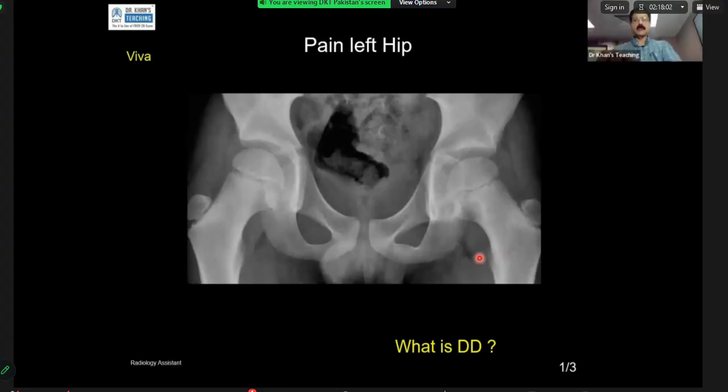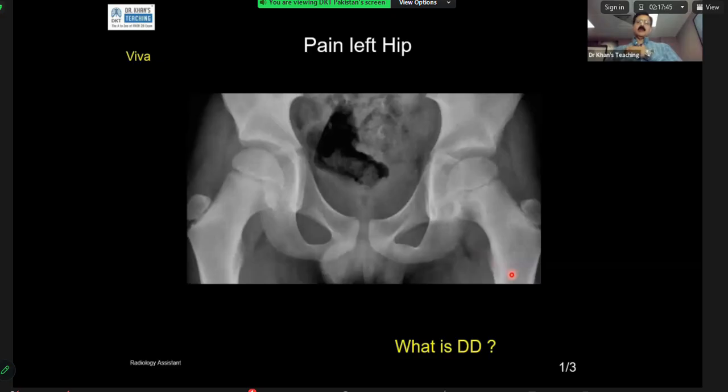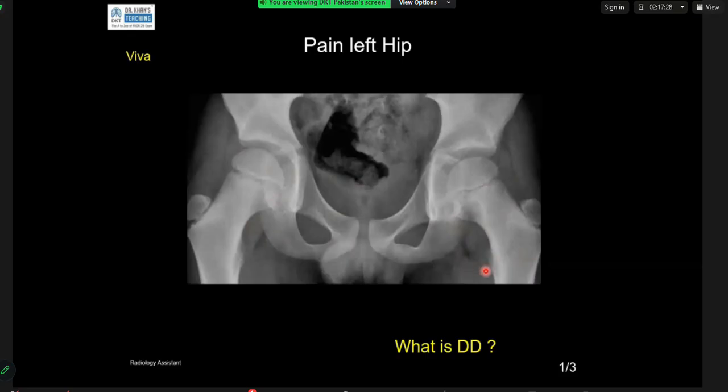This patient has got pain. And I would consider an infective cause for such a lesion. Look at the capsular fat plane. Compare this with this. What do you think? It appears displaced. And this is the iliopsoas fat plane. What do you think? It does possibly represent an element of effusion adjacent to that lesion. So I would also consider an osteomyelitis potentially.